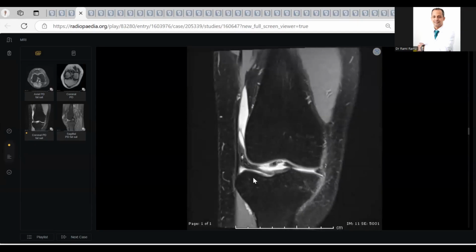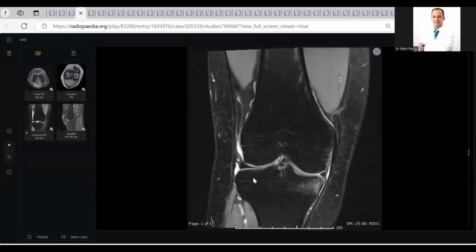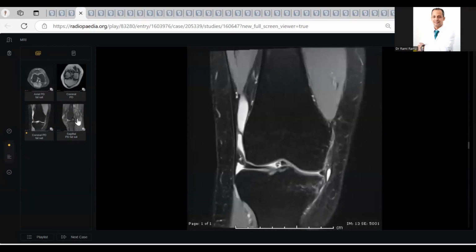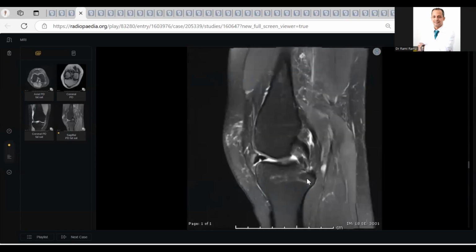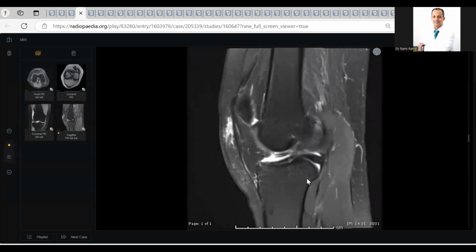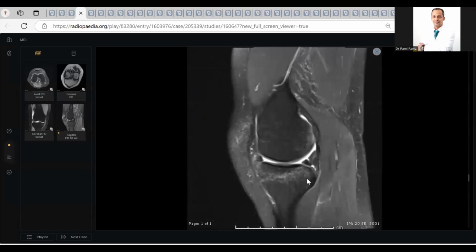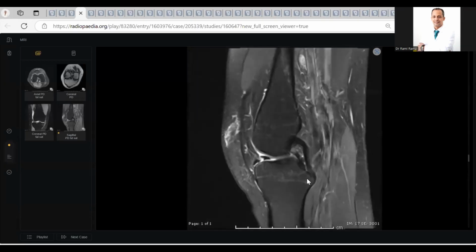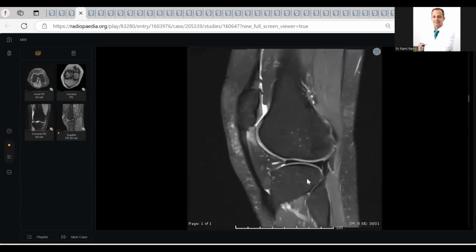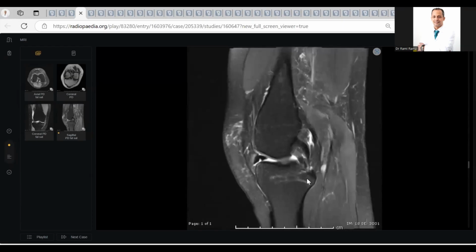Okay. And there is mild joint effusion with fluid in the suprapatellar joint space. The medial collateral and lateral collateral appear fine. I want to see the PCL, it is also fine. Can you show me the ACL? I could not appreciate the ACL. So, your diagnosis? Medial meniscus injury, tear of the medial meniscus and ACL. Unhappy triad maybe. Unhappy triad.